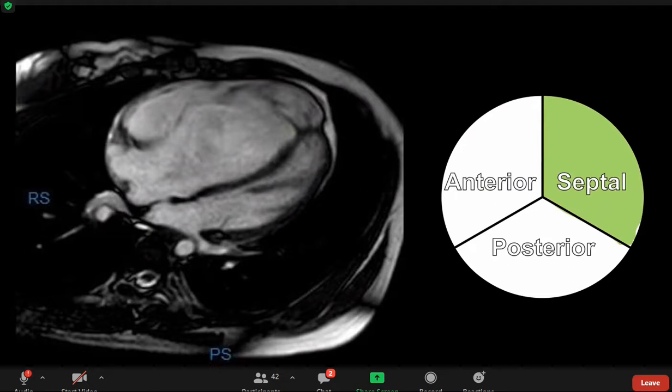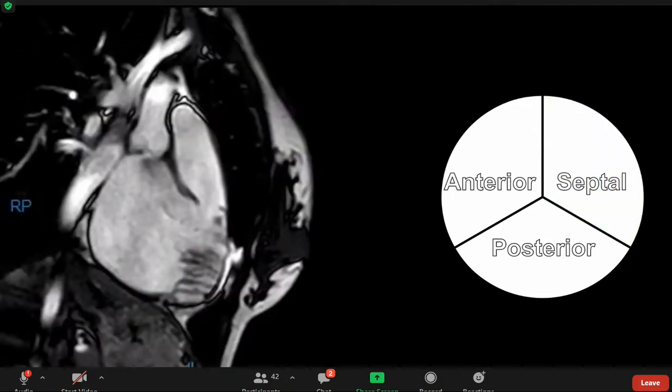We also see that the septal leaflet is displaced apically as well. Here in this oblique image of the right side of the heart, we can appreciate the posterior leaflet. It's also apically displaced, and if we notice, there are muscular stumps that are tethering towards the posterior leaflet, causing it to be tethered and with resultant malcoaptation of the valve leaflets.